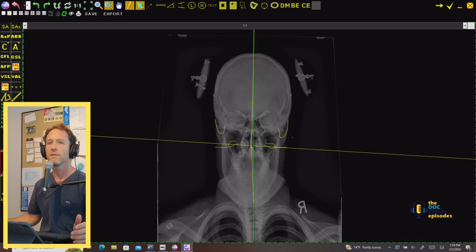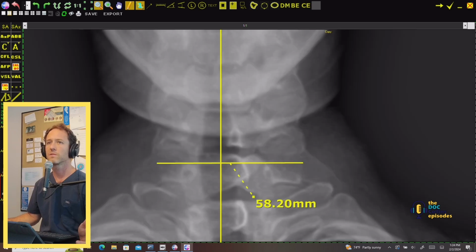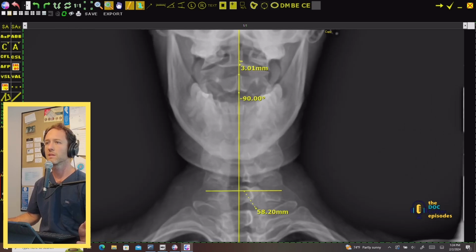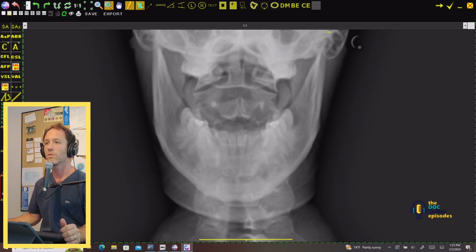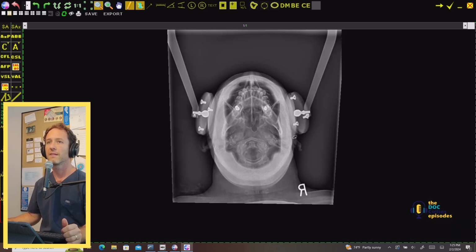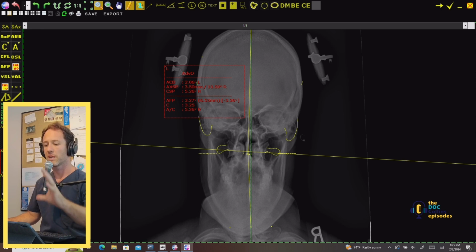All right, so that is my kind of quick workflow here. You would also have, from the axial view, you would drag in your axial surface, which I won't go into now, but just like you did the condylar circle, you would get the circumference of the C2 surface. And then from your horizontal view, we would have the atlas rotation relative to the skull. And then that information would come in and populate their listing.